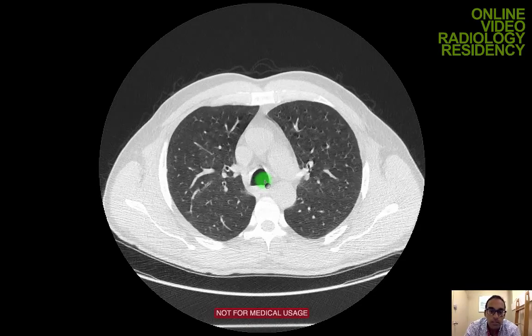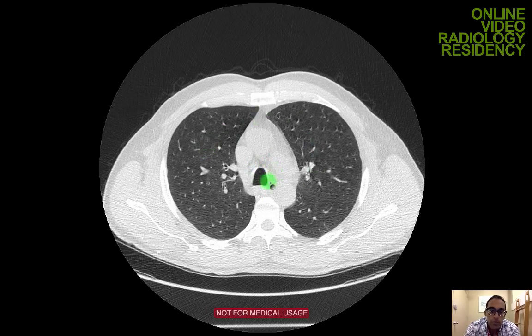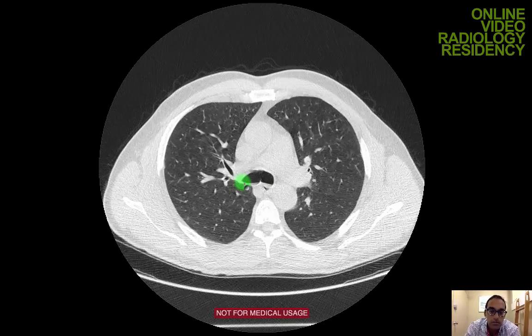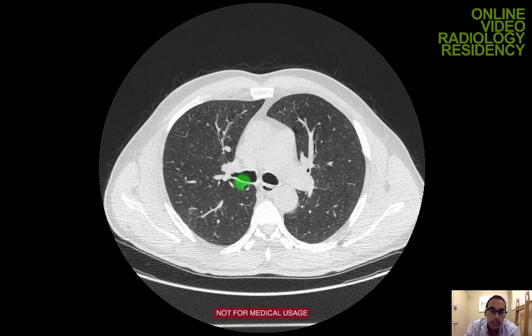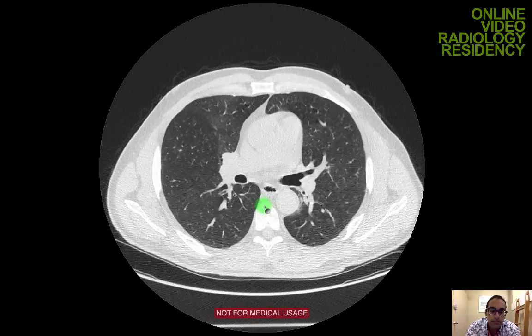So basically, the basic approach I have to imaging is I know about the technique, I try to know the anatomy really well, and then try to know about common pathologies I'm likely to see and how to diagnose them. And then as far as a search pattern, you want to take the chest and split it up into different anatomic sections and look at each thing separately, again confirming normal anatomy and then trying to exclude common diseases.